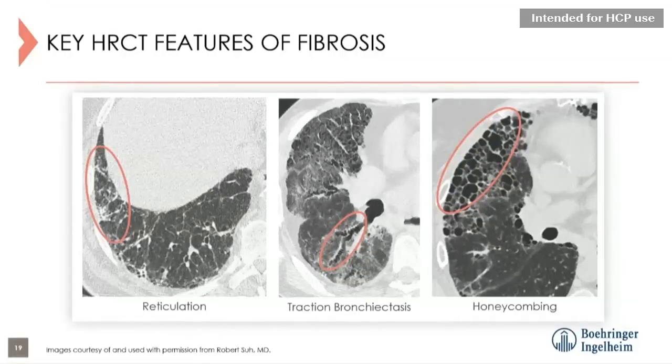And here in the middle image, we have a very nice example. You can see a very corrugated and dilated airway with varicoid features. But notice how irregular and abnormal that airway looks. If you look immediately outside, you can see that lung is completely abnormal. And putting two and two together, you should think that the reason why this airway is dilated is because of the abnormal lung, i.e. pulmonary fibrosis.